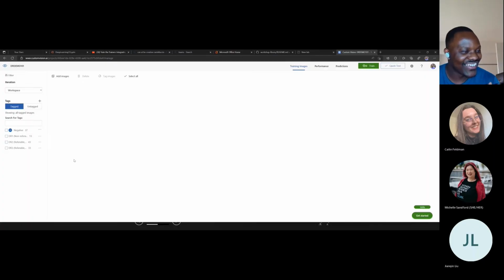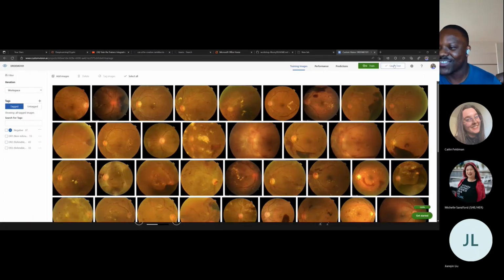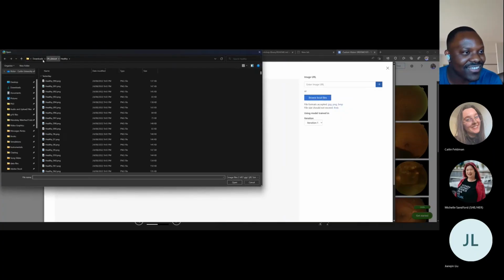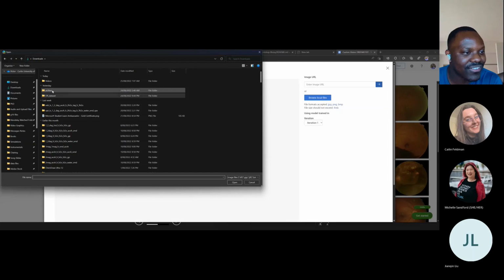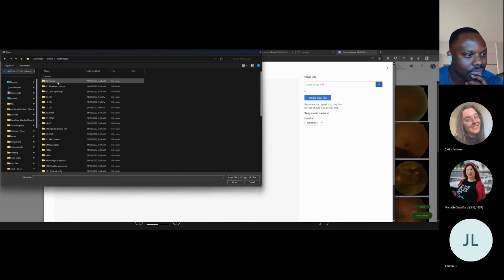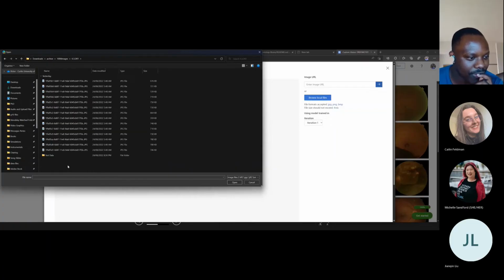So let me just double check, since I think maybe when I go live things are different. But let me try this one as well. I might as well demonstrate. Just do a quick test. So browse local files. Let's see. This is the data set. I want to use the archive. Yep. So DR1 for this one.